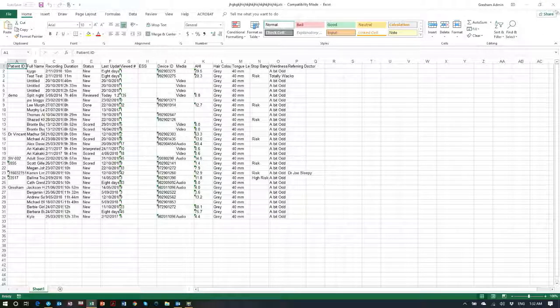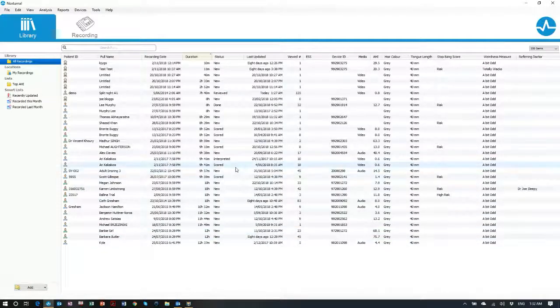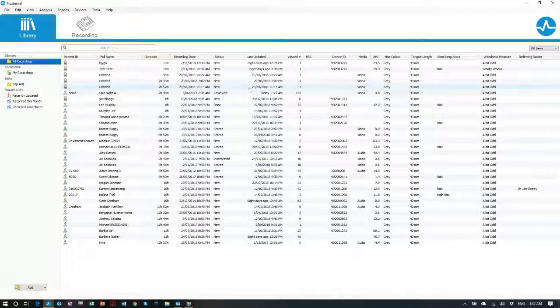And what I've just shown you there is the result of perhaps 2 weeks hard labour by a master's or PhD student, and I've just shown it to you in a matter of almost literally seconds, I guess. So that's very easy. We can also reorder these as well. We can shift them around. I think I've just shown you everything I need to show you there, so that's good.